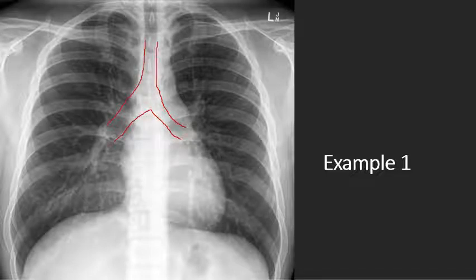And if you see that in your mind's eye, you can say, oh okay, well, if I had a tube in here, which I'll draw, then I need to be right around here because that's going to be the 3 centimeter mark. And you can use the measurement tool on your PAC system to determine where that is.